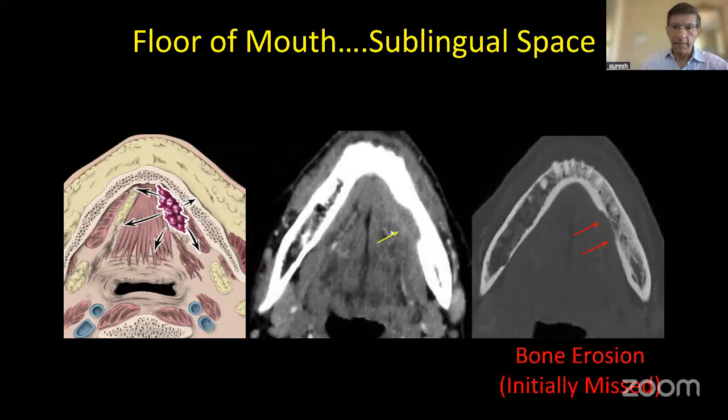But on the other hand, this is another example of a patient that has a squamous cell carcinoma involving the floor of the mouth. So again, look at my tiger stripes. We see a nice clean lingual septum. Here's the mylohyoid muscle. This is going to be the hyoglossus muscle. Very, very nice gray, black, very nice tiger stripes.